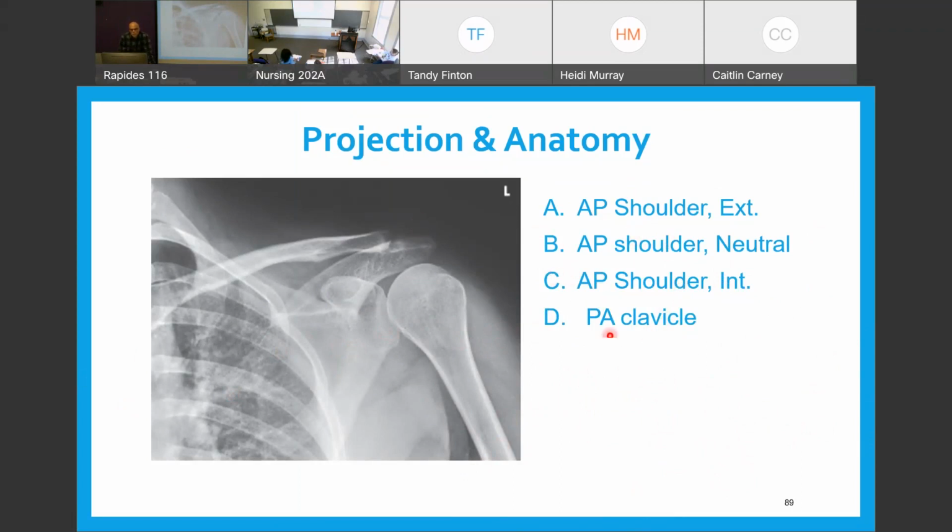Sydney. What'd you say? What do y'all say? So it's AP shoulder width. Because what is this? Greater tubercle? Everybody agree? Ms. Shelton, you agree? You see this big bump? Yeah. And what is that? The greater. There you go. All right.